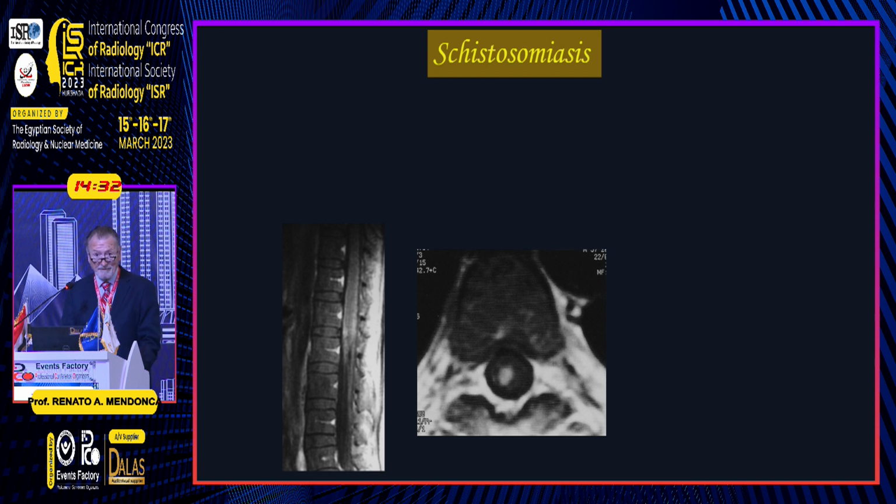Schistosomiasis is something that you have here. You have the snails, and you have the schistosoma here. So when we find some kind of swelling and some kind of nodular enhancement or serpiginous enhancement in the conus medullaris, we have to think of schistosomiasis in my country, which is an endemic zone. The diagnosis is confirmed by an immunoassay test or by rectal biopsy.